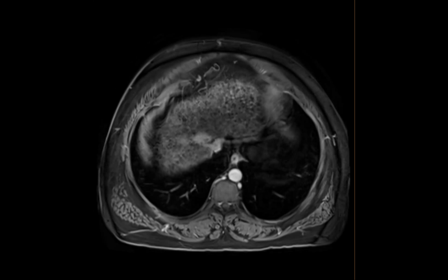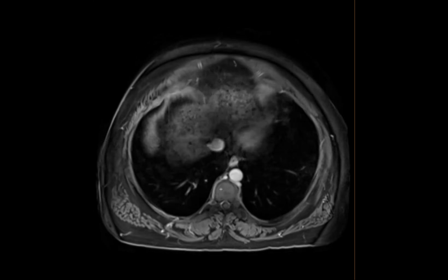That was a great review. I have a couple of questions. So you guys biopsied this, right? Yes. And my other question is, if you were reading this, would you have called it LR4 or LRM?